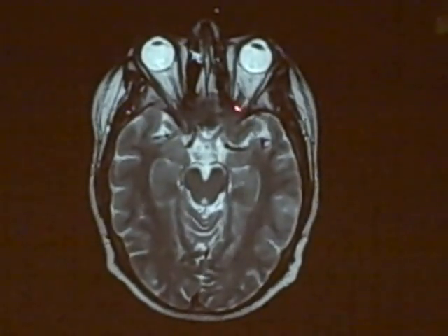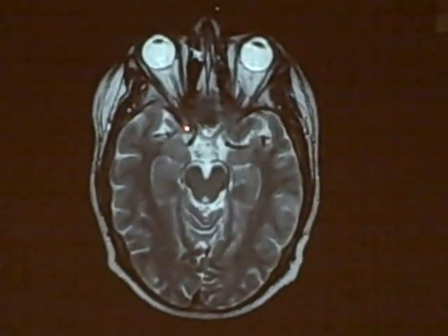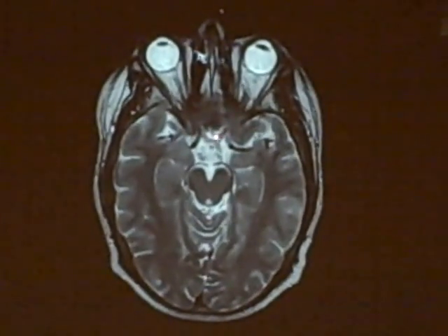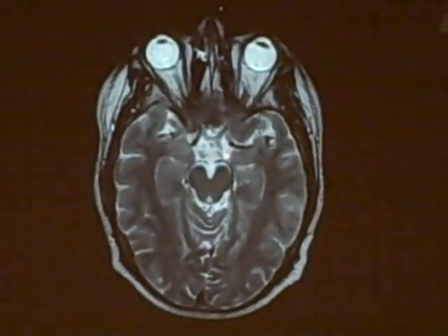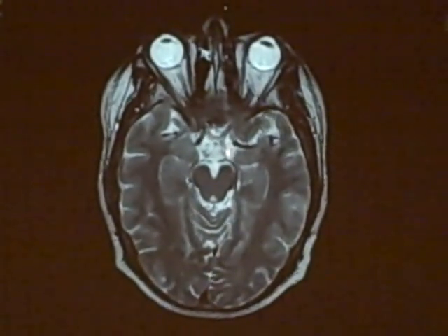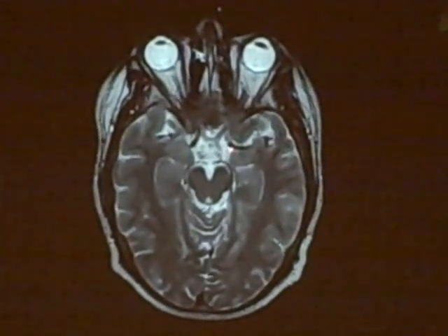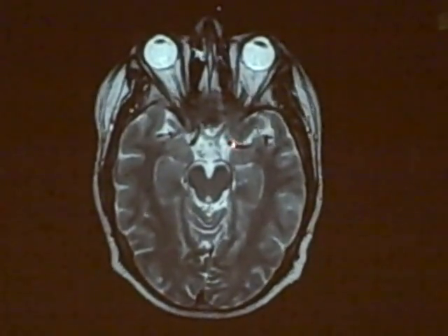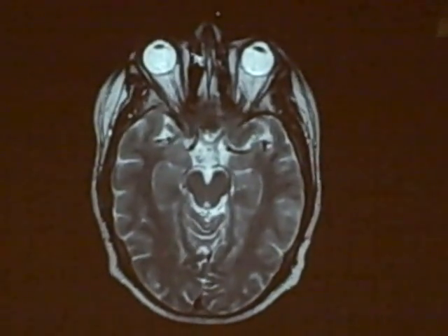Okay, the other thing we can see here is the optic nerve coming in right here and over here. So we have optic nerve, chiasm, and optic tract that are seen here on this side. Okay, so this is a dark area here. So this is a blood vessel. The internal carotids are gone. They've broken off into the middle and anterior cerebral arteries.